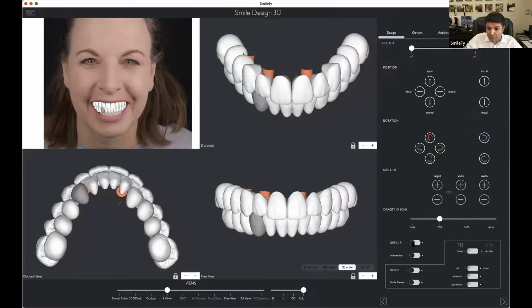So let me show you something. I'm going to adjust. Yeah, that's a little bit too wide. We're going to also still work on the automatic generation of the teeth position and size. You see, it's just a little correction here of the lower canines, but I think now it's fine.